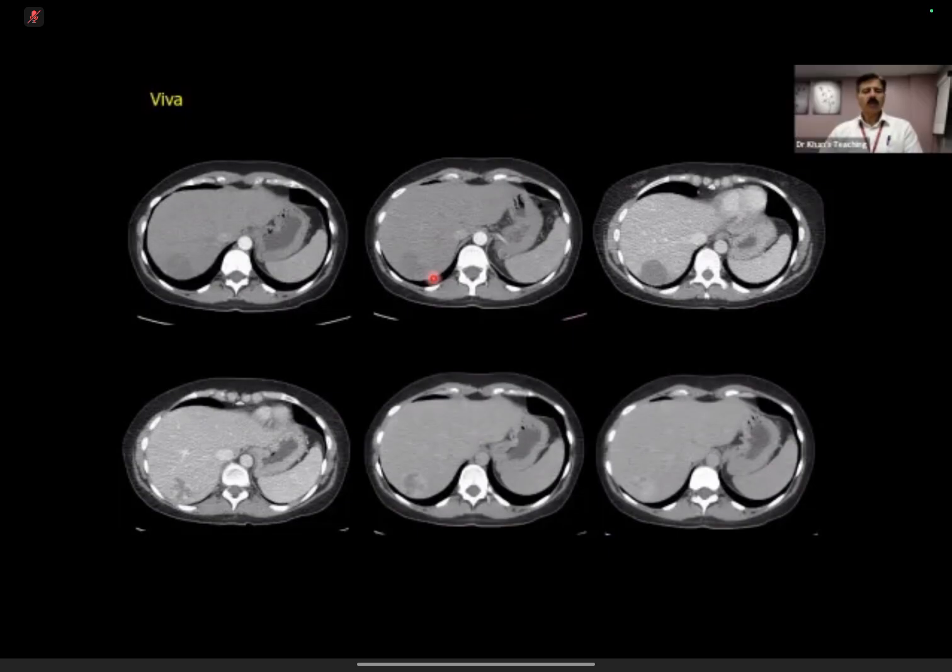Okay, good. If you see here on arterial phase, it does not show much enhancement. It can at times also. Then you picked up well. In this particular case, we did a few delayed phases, and this is what we used to do before the MR world. And you can see this nodular enhancement, which has occurred in a slightly late phase.